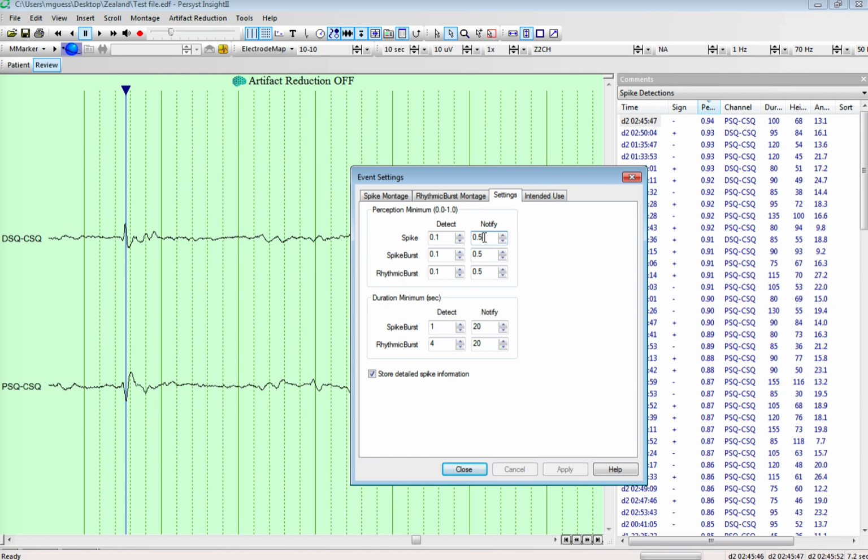of sensitivity and specificity. Something to keep in mind as well is this detector was not trained or tested on 2-channel recordings of this nature. So while it may appear to work fine, this is something where you also want to do a visual inspection to see how it's performing, because this generation of detector was also trained and tested on scalp 1020 EEG recordings as opposed to 2-channel.